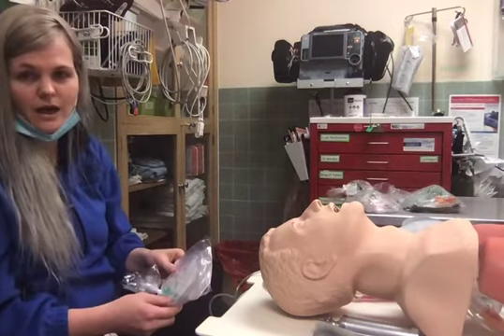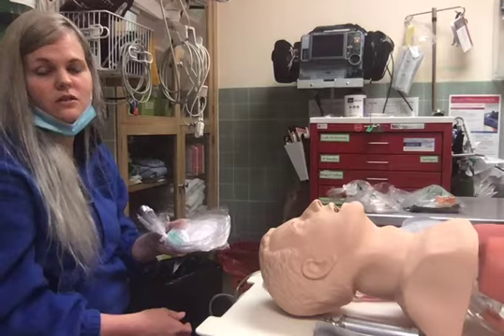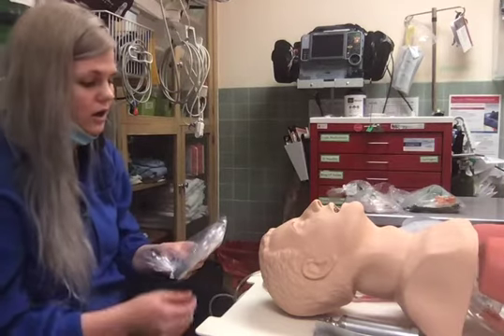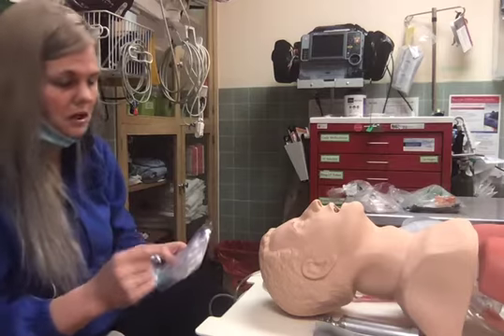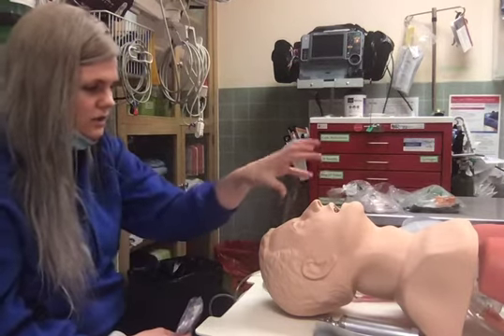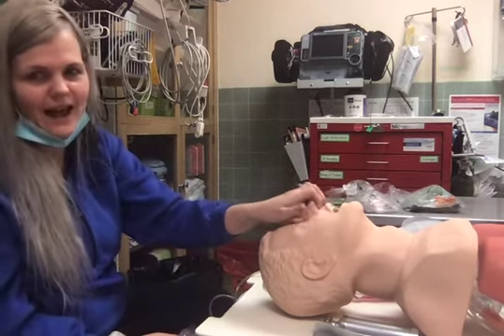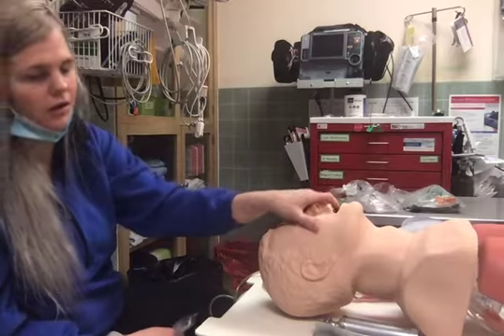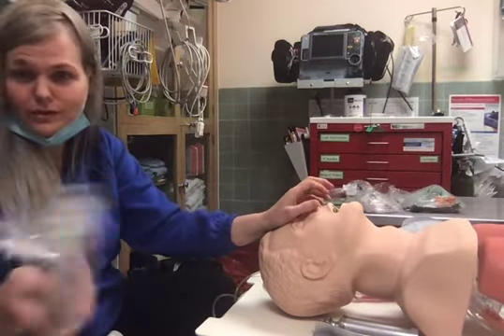Once this becomes inadequate, that's your contraindication. You're not going to be able to use these for patients that are in severe failure. Once they step out of this, that's when it becomes a contraindication. As far as anything else, you're going to be looking at facial trauma, anything to make it so this doesn't add anything. If you have a face blown off, putting a nasal cannula on them isn't going to help. Granted, it's not going to hurt either.